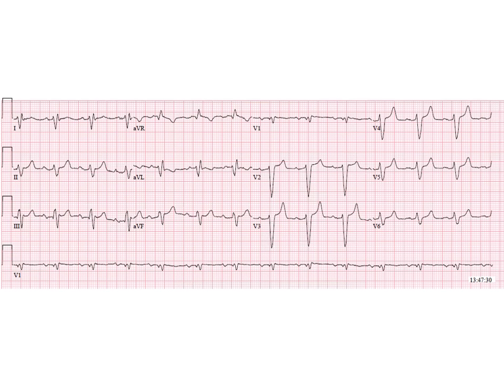This is our next example. This one, a little tricky at first, but hopefully after I point this out to you, you'll never get this question wrong because this is very high yield. What do you see on this ECG? Pause the video if you need more time, and in 3 seconds, I'll give you the answer.